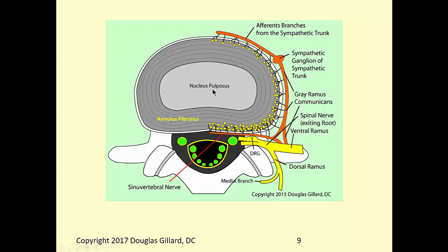80% of the weight goes through here. 10% on this. What's this thing? It's a Z joint. Another Z joint. So 10% on each side. By the way, this is called the what? This is a column. This is the anterior column, and these are the posterior columns. When you do interbody fusion, you have to fuse the anterior column and the posterior columns. Can't forget about those. And if this is, well, I know this is L5.